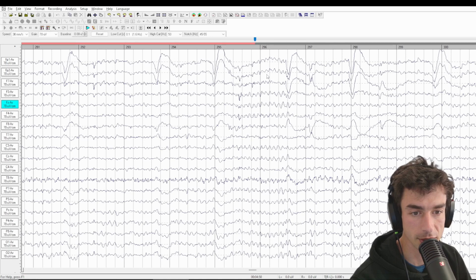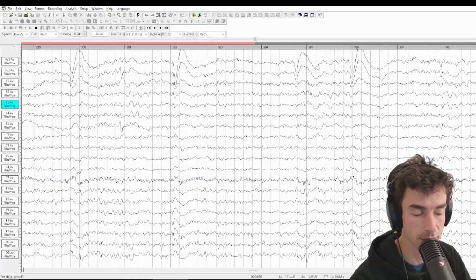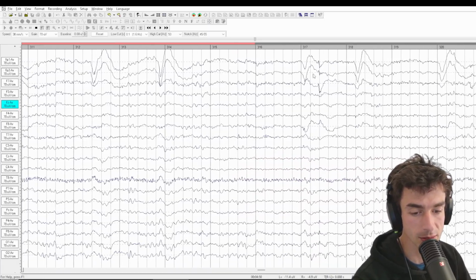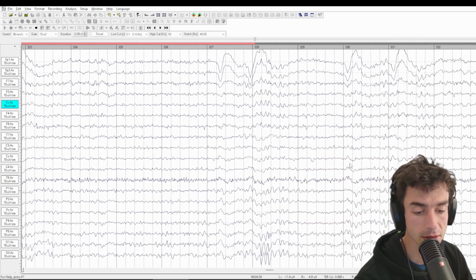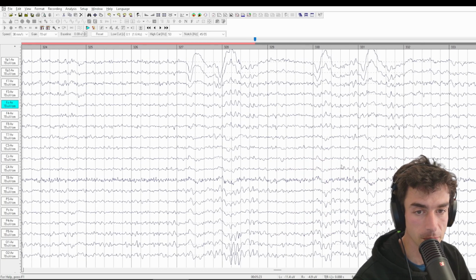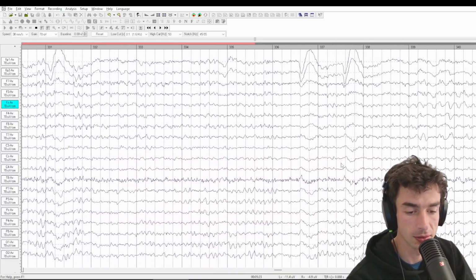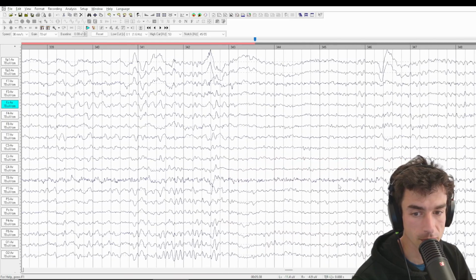Look at this alpha burst here. Low amplitude and actually generalized. And this is a little bit faster than the alpha that we saw before. That was around 12 hertz. So we could also be witnessing some state instability as far as the alpha tuning, right? If the alpha wanders around with changes in vigilance, that can indicate some issues in terms of maintaining the same level of activation.